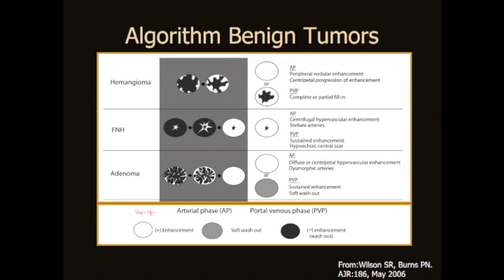And of course, with imaging of adenomas on both CT, MR, and on CEUS, we're familiar with the fact that a good proportion of these lesions will show weak washout. But nonetheless, the fact that these lesions have these specific arterial phase features and this tendency to sustained enhancement really helps us to be exceptionally accurate for characterizing these benign lesions.